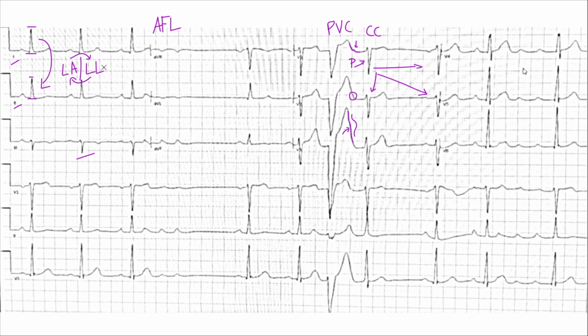When this happens, as a consequence, oftentimes, not always, but oftentimes, you will see lead 3 having a predominantly negative and kind of small QRS signature, if you will. So I'm like 100% sure that this is left arm, left leg inversion here.